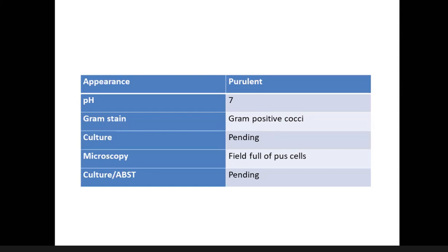Clinically, it has to be upper zone, middle zone, or lower zone. When you take the right chest X-ray, if the right heart border is obliterated, it is the right middle lobe. If the diaphragmatic border is obliterated, then it is the right lower lobe. That is using a PA chest X-ray. The other thing you can do is a right lateral chest X-ray.